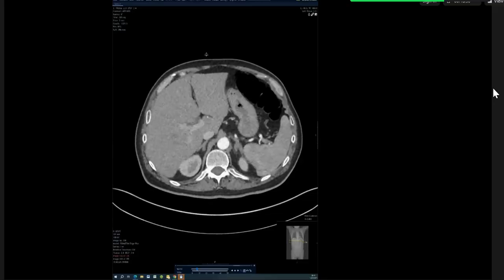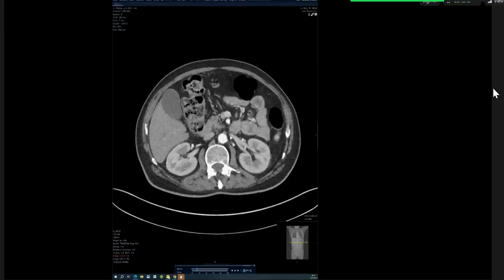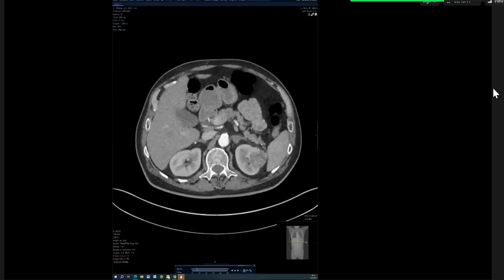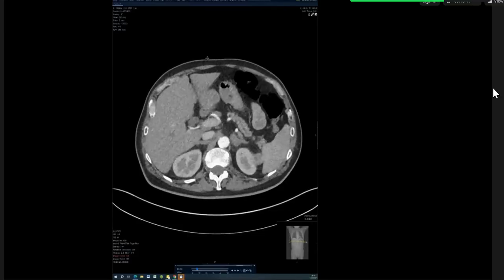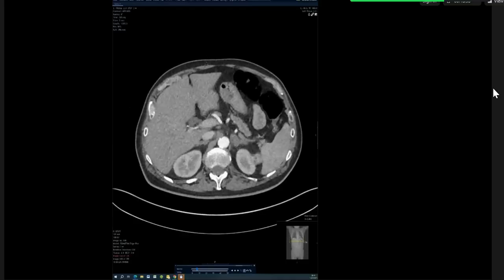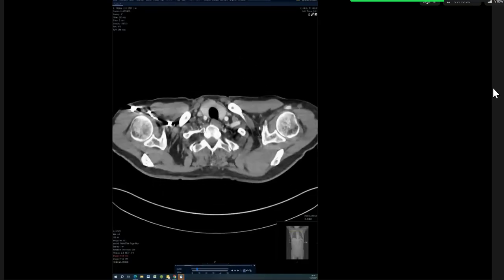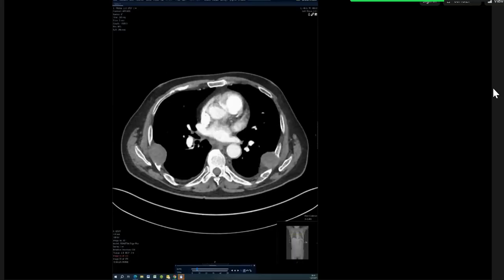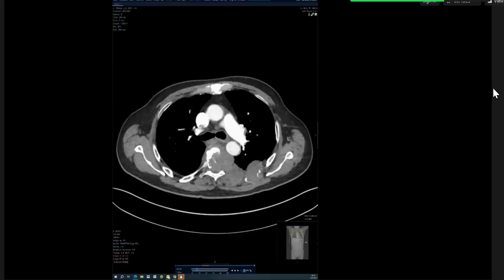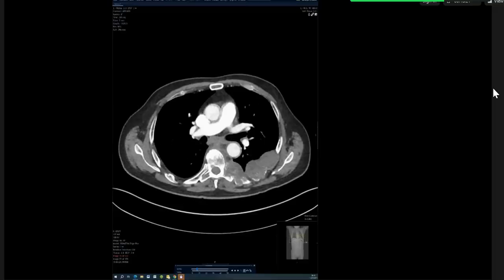Normally, I would look to see if there's any adjacent lymph nodes. And I would check to see if there's involvement of Gerota's fascia, as that would change the classification. I would look for other lesions, and I would interrogate this in a coronal view. And apart from that, if I'm only given this and there's no abdominal imaging, this is as far as I can take this image. Okay, so you're suspecting an RCC with bone metastasis, I'm guessing?